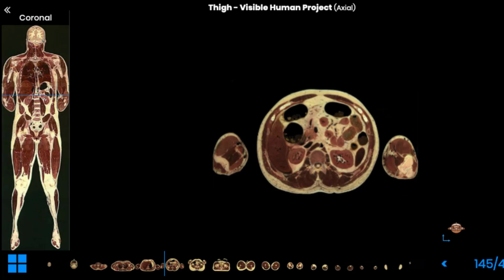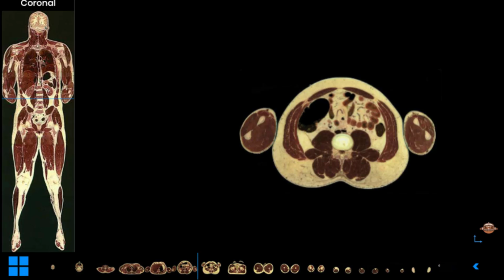Next, we're going to look at the arrangements of organs and muscles of the abdominal wall at the axial views. First at the Visible Human project and then at the CTs. So let's begin. Let's identify the muscles of the abdominal wall at this HV dissector image.